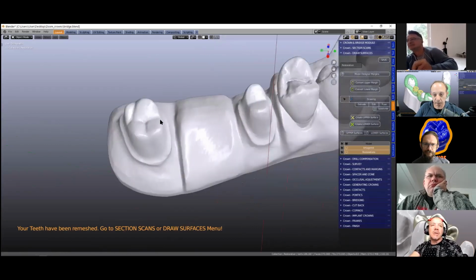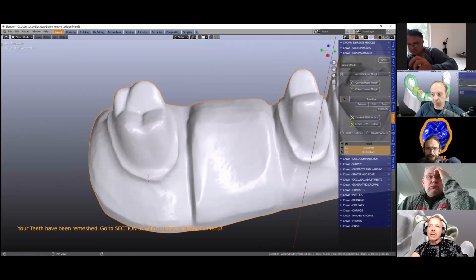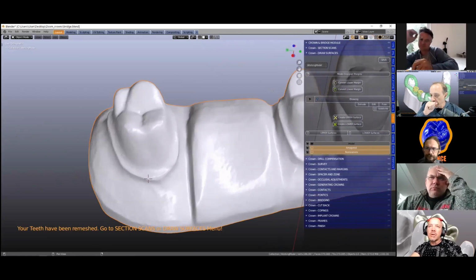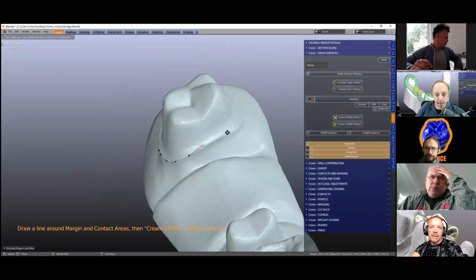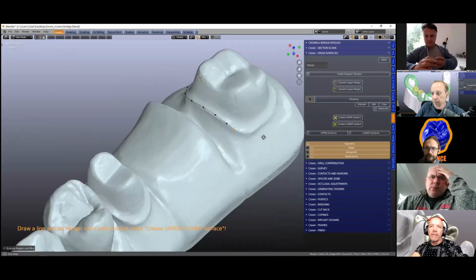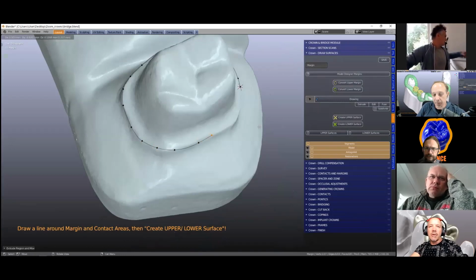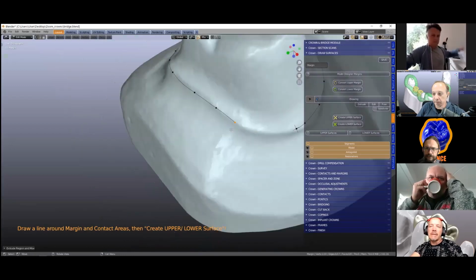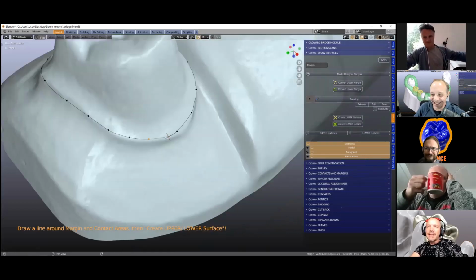These are to make our margins, basically. If we're using the model design and we've already got margins, we would use this menu just to convert them. Obviously we haven't got that now, so I'll just make my margins. This is going to take a little while, so grab your coffee or whatever it is. I'm not going to focus too much on accuracy here, just to save some time. Ivan's got the coffee. That's number 1.